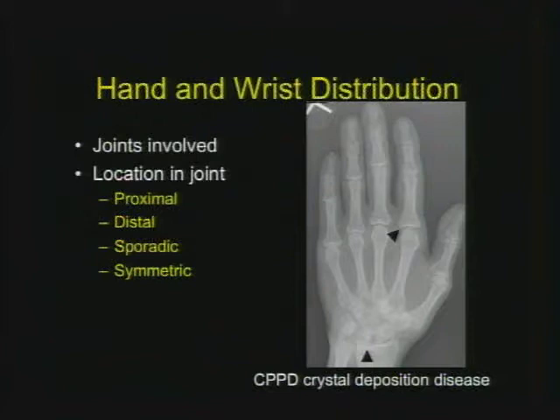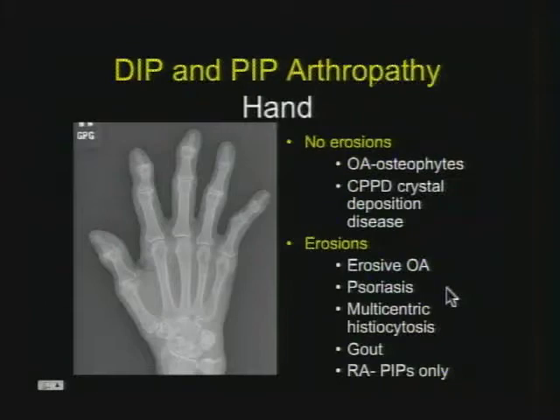And this one, actually, when you look at where these are involved, you think rheumatoid, but you'd also think CPPD, crystal deposition disease. You think about radiocarpal and metacarpophalangeal involvement for both. And this had no erosions. I would try to look for calcification, especially of the triangular fibrocartilage or the lunotriquetral ligament. You might see it in capsules too, but if you don't see it, it still could be CPPD, crystal deposition disease.